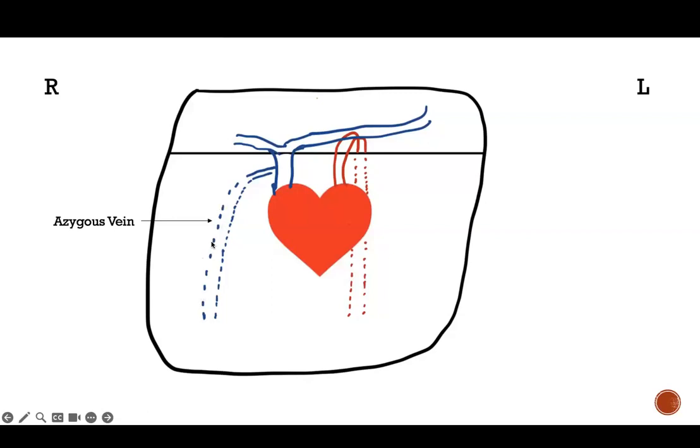Excellent. But you'll notice something, that the azygos vein is posterior, but this part over here is not dotted anymore. Okay. Now this part is separate from the azygos vein, and we call it the arch of the azygos vein. It's not in the posterior mediastinum anymore, because imagine with me that the azygos vein is at the back, okay? But it needs to join the superior vena cava.